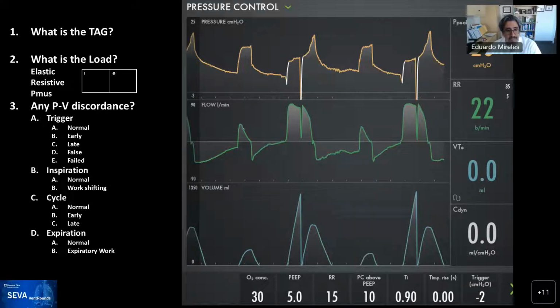I don't see any geometric waveform, and more importantly, it seems that this breath over here that I'm going to label breath number 1, and what would be breath number 3 seem as mostly passive breaths, and we can see that it has an exponential decay, and the curve for pressure actually looks as a square. So this is, and Kunal put there, pressure control.